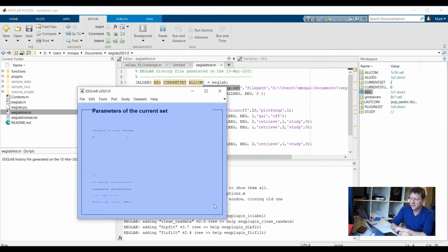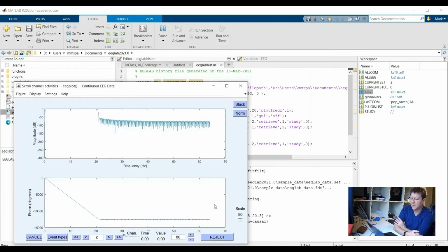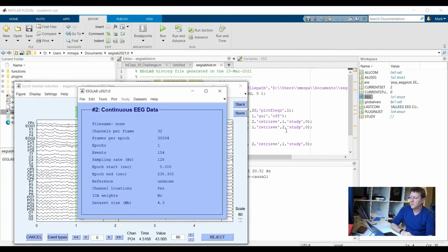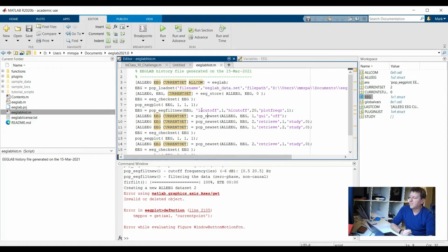that we did before. So it's opening the files and it's showing our filters, and it's opening each of the steps that we did. It's redoing them. Some of them are not interesting for us. This is the demo problem. Always something going wrong. But let's ignore that. I clicked a window away before it was used.